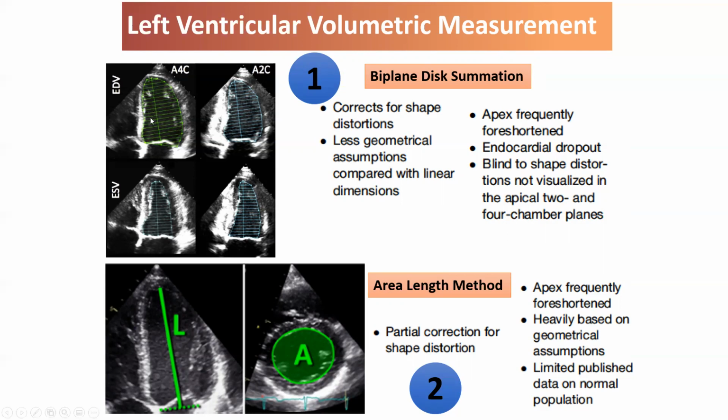measurements. For end diastolic volumes, I go about a third of the way in on the wall, and I'm trying to get to a point between the trabeculated and the non-trabeculated or the compacted myocardium in the left ventricular wall. I err a little bit more toward the trabeculated layer on the systolic dimensions, but pretty much, as you can see from this diagram, you're looking for the compacted, non-compacted interface in drawing your endocardial to blood pool edge.